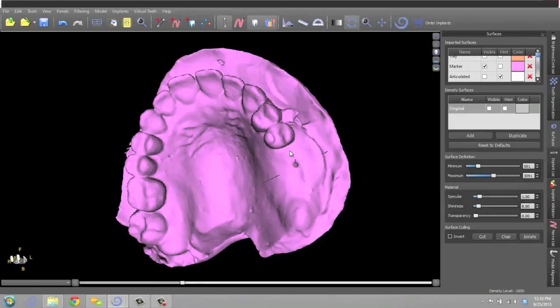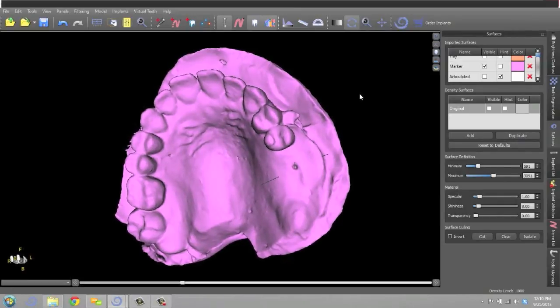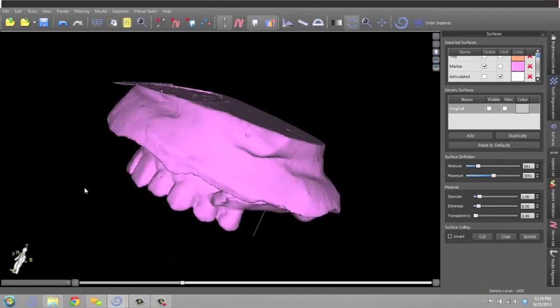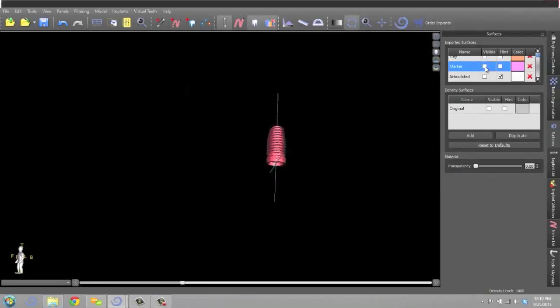And I'll try to put that divot in the apex of the crest of the ridge. Now, this is being done without regard to where the bone is. And it's a reference point. It's a really useful reference point for virtual planning. And so we call this model with that little divot marker. The model without the marker is called tray.